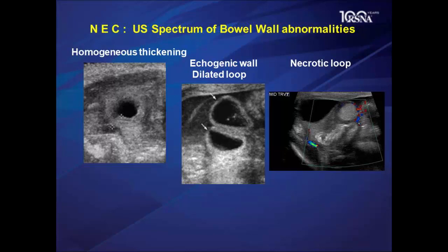It's echogenic. It means cellularity, either hemorrhagic or infectious. Here on Doppler, you see the power of color Doppler. Here some bowel wall is vascularized, but this loop is not moving. It's echogenic. It's dead, necrosis. So this is an important sign to tell the surgeons, because you know this is dead bowel, and most of the time it's confirmed on surgery.